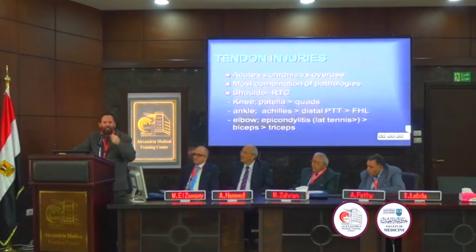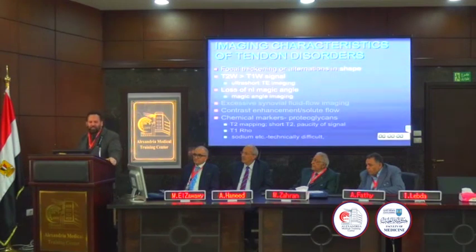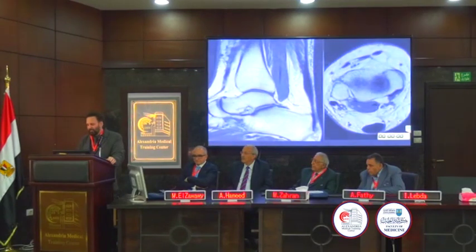Emotionally, but intellectually he knows it didn't. So we make this distinction, but it's kind of artificial. So what do we see on imaging? Well, the first thing we see is thickening or alterations in tendon shape. So here's an alteration in tendon shape, right?